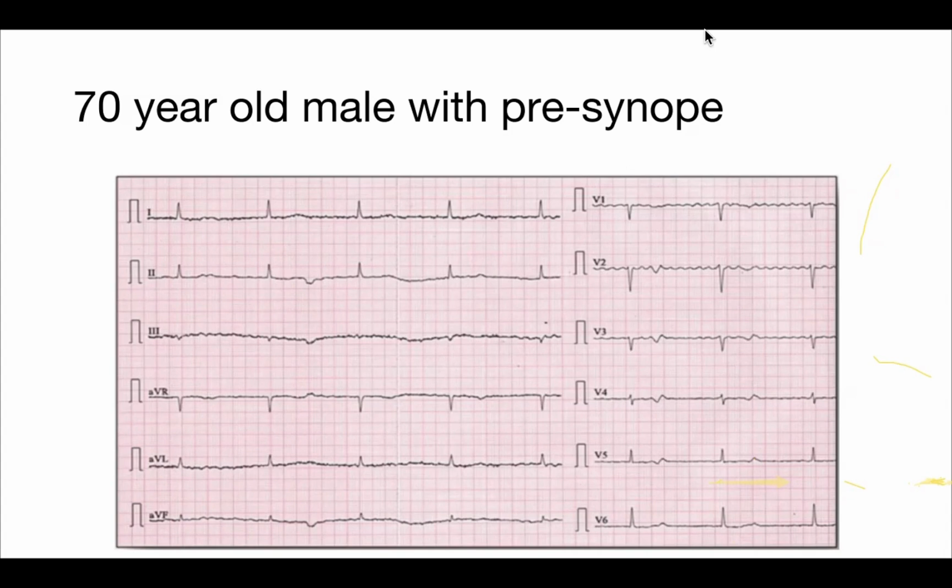The whole impulse goes around the tricuspid annulus, so we have physiological limitations, that is the conduction velocity of the cardiac muscle. The maximum rate is 300 per minute. Also, in any atrial fibrillation there can be organized fibrillatory waves, and usually you see these waves in V1 and V2. So don't take them as flutter. That is a learning point.